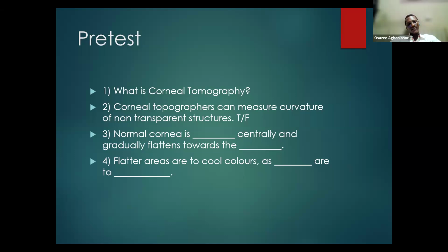It has to be a cross section from point A to point B, the superior to the inferior, the top surface to the bottom. But it must be a cross section. Topography is just the top; we are looking at just that anterior part alone. That's absolutely correct.